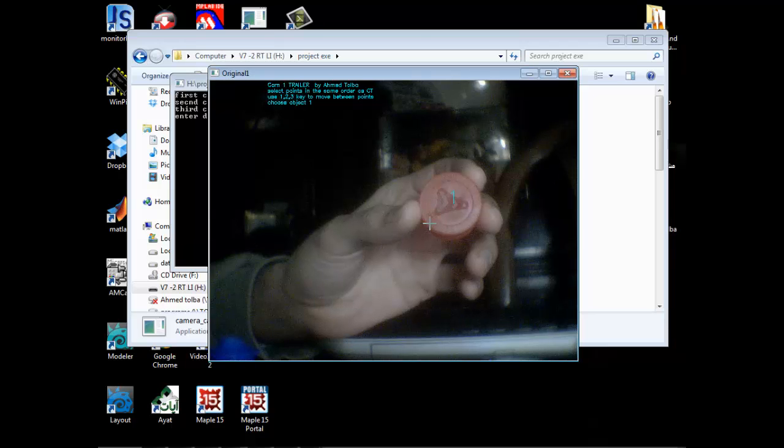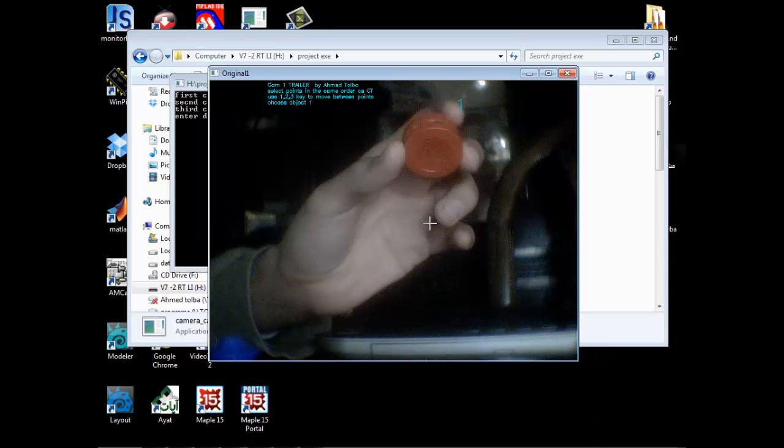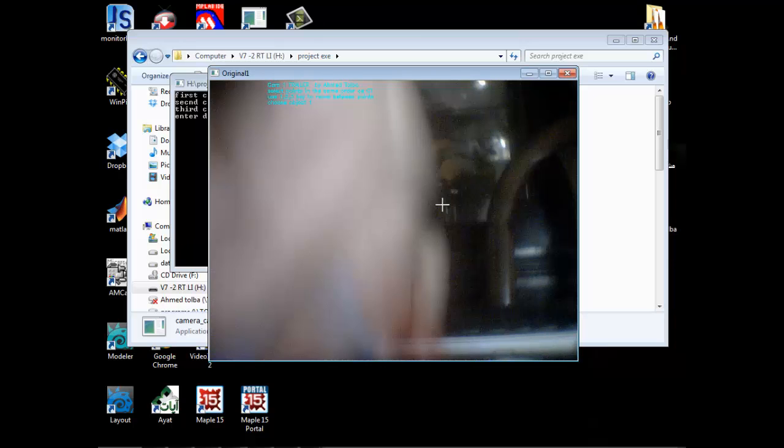Okay. Now, let's say lighting is different, and I can no longer detect object 1. It just shows somewhere else. I just go and click on it again. Voila, it comes again into object 1. Now probably I'll be having 5 markers, 3 on the human and 2 on the probe. So let's say those are the 5 markers.